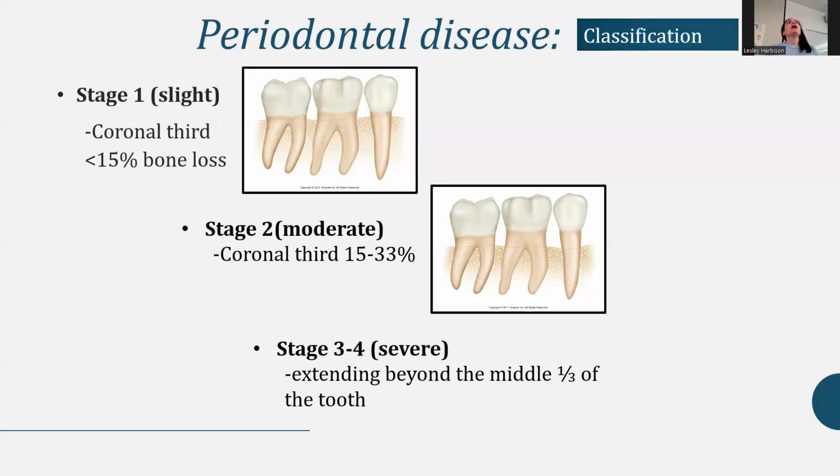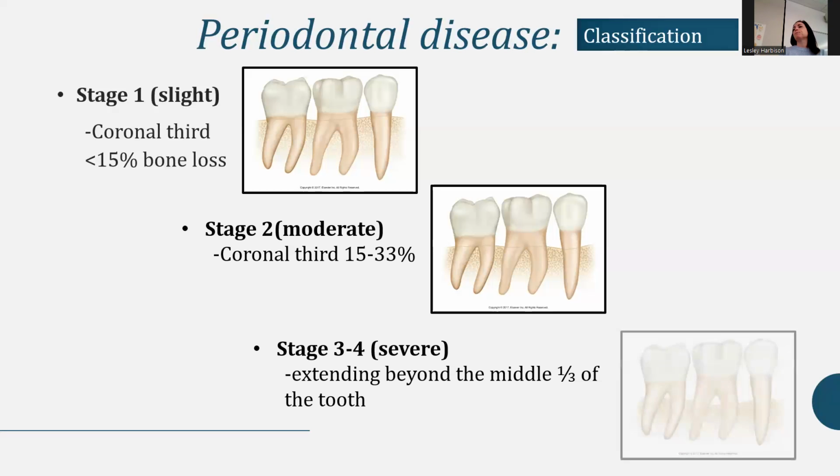You can, it's just not calibrated is what I've noticed, but I wanted to talk to Santoro about that because a ruler, like that's what's great about the digital imaging is you can measure. So you could be like, oh, is this more than 2 millimeters or is this, blah, blah, blah. And you could actually get some digital radiograph help in the software. So that would be very nice. I would like that if you could do that. We'll have to look into that and see if it's calibrated so you can.